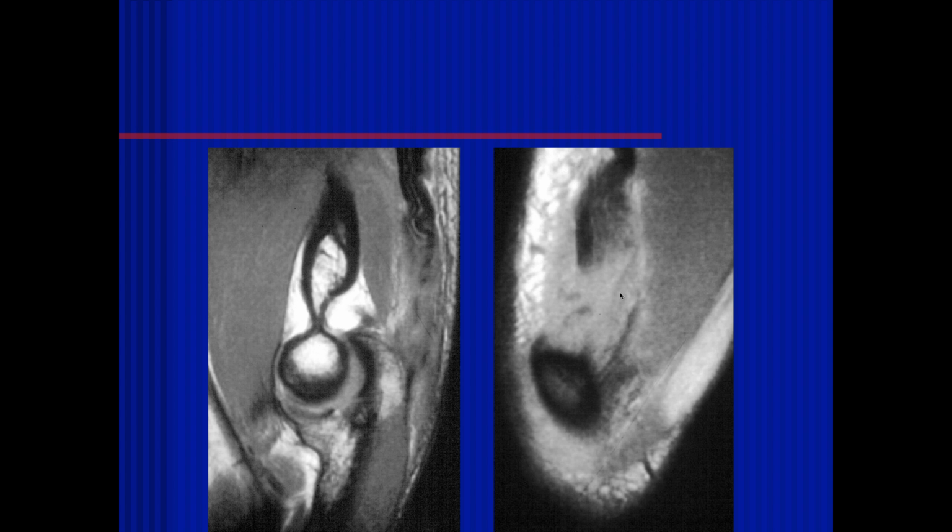Michael, what do you think of this case? Okay, so this looks like there's a complete full thickness tear of the triceps. It looks completely torn and retracted. Yeah, so this would be a grade 3, right?